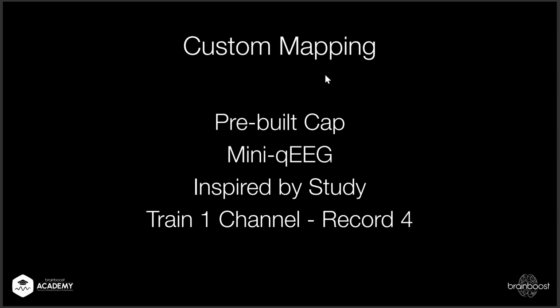I will explain why you would need a custom mapping. You might want to do a mini QEEG. Even if you have a 24 channel device, you might want to just do 4 channels in a Y shape. You might want to do 8 channels or something in between every 3 or 5 sessions. So you have less work, but you still get a bigger picture.